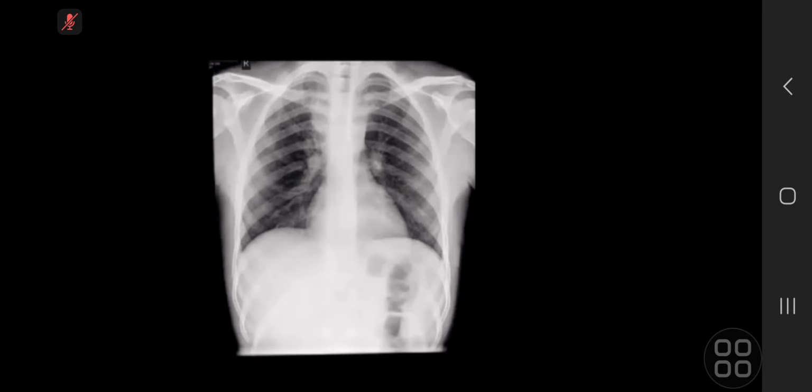So this is a frontal radiograph of an older child. The right paratracheal stripe appears expanded, and there's bilateral symmetrical hilar adenopathy. There's also increased lung markings bilaterally, which appear to be symmetrical. Given its appearance, my differentials to consider would include sarcoid and TB.